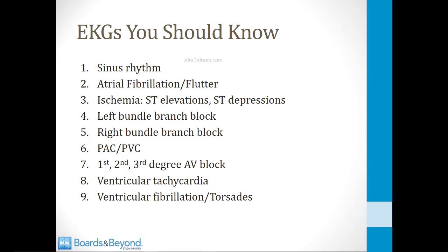What I've shown on the screen are 9 EKGs that I think medical students should be familiar with. These are the type of EKGs that may come up on the Step 1 exam. They're also the type that you may be shown as a third-year student on rotations and you ought to be able to recognize.